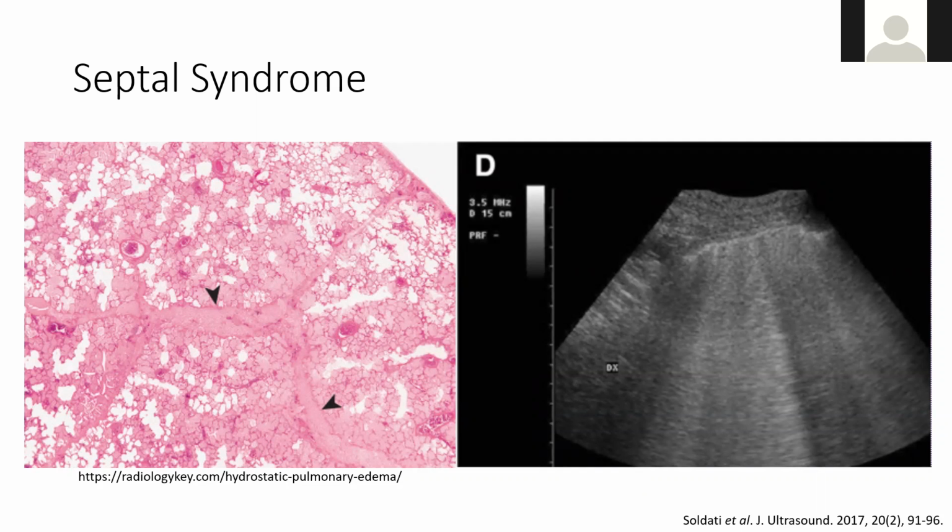In the pre-alveolar stages of cardiogenic pulmonary edema, the interstitial fluid accumulates in a centripetal manner from the periphery to the pulmonary hilum, expanding the lymphatic vessels and consequently the secondary or interlobular septa. What that causes pathologically is you can see the arrows denote these thickened interlobular septae.